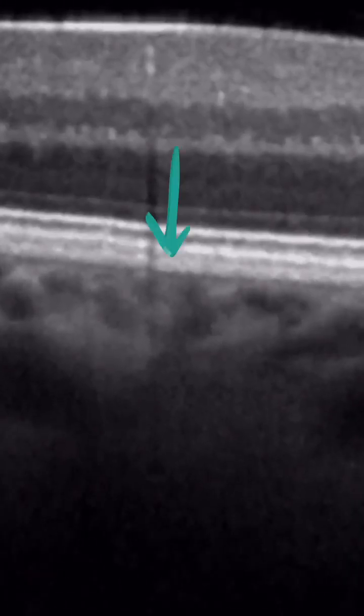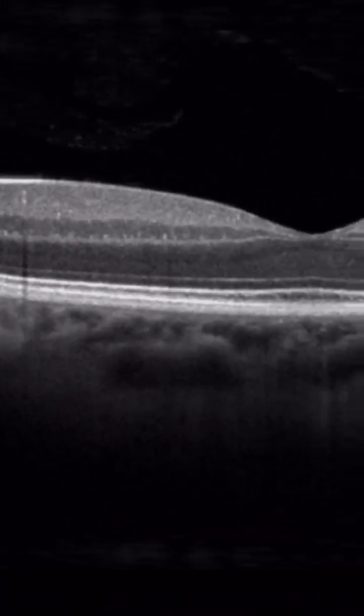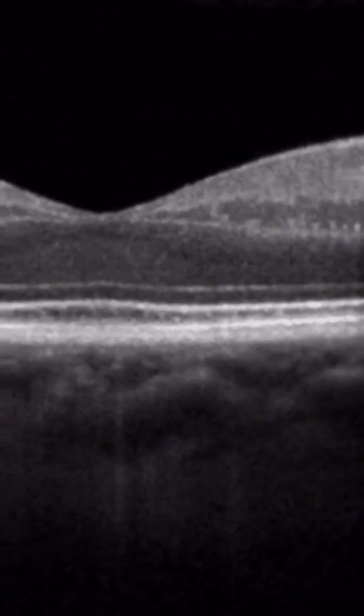The first I look at is the RPE, which is the easiest to locate, the most reflective structure. And just above this, I look at the ISOS, which is this line over here. The ISOS is really the structure that will tell you the visual potential in that area for this retina, right? They pretty much come together because without RPE, there are no photoreceptors. So if there is any disruption of the RPE or the ISOS, you know that the vision in that area won't be that great, okay? So let's see some examples.